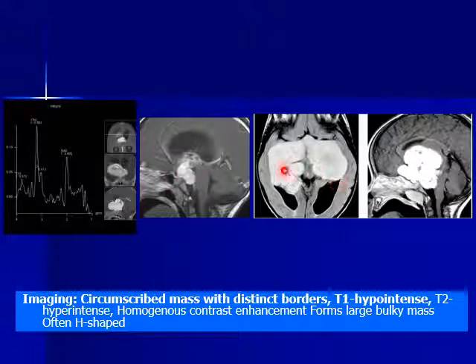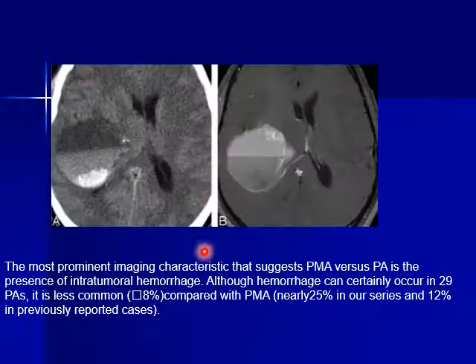It appears as if it is a high proteinaceous cystic lesion, but with contrast, it avidly enhances, and it likes this area, the hypothalamic chiasmatic region. This is what is called pilomyxoid astrocytoma. It may involve the cerebral hemisphere and may show hemorrhage inside, giving fluid levels like this.